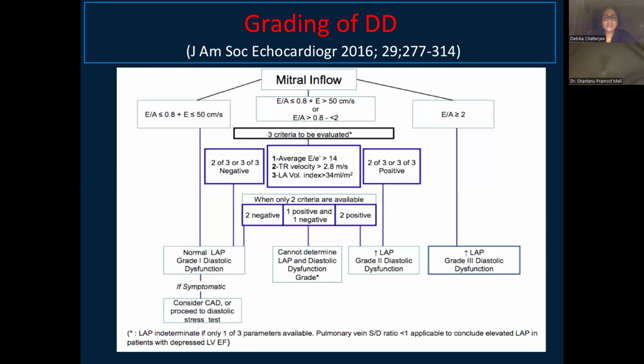And now let us look at these, the middle arm of the mitral inflow patterns. These are the patterns we get every day, in many cases, either these or that. So you have to know all these patterns. Depending on the disease condition, the Doppler pattern of the mitral flow varies.